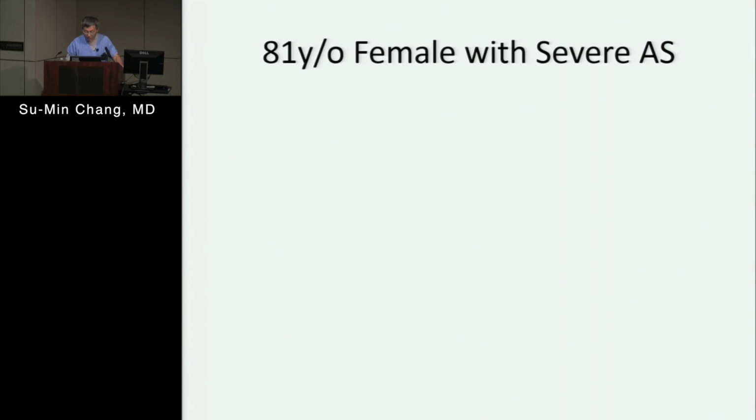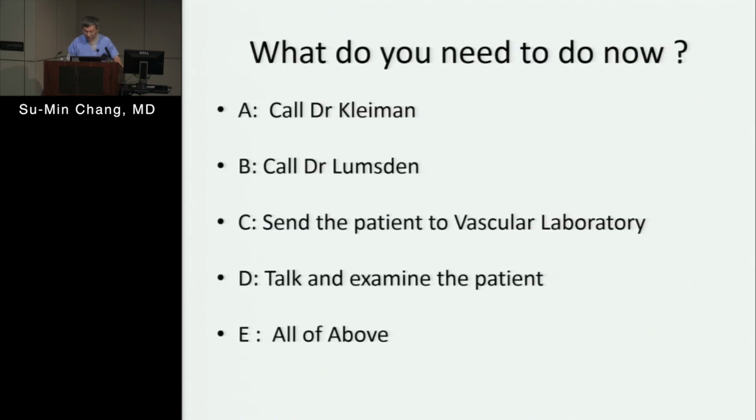So this is the old case that I had. This is an 81 year old female with severe AS, referred here in the early days of our TAVR program. She came here evaluated already, including cath. So the cardiac catheterization was done here. But she came here with CT.